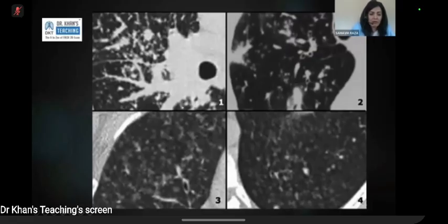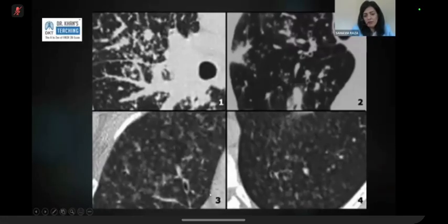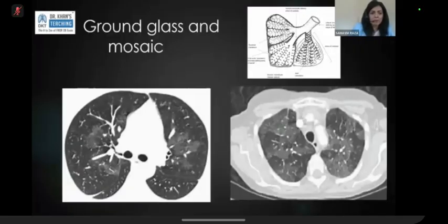Number 3, if you look at the pleural surface, you can see that there are nodules going all the way up to the pleural surface. In some places, whereas other places it's not. The bronchovascular bundles are smooth, they're not nodular. The pleural surface on the other side looks smooth. There are quite a lot of nodules, but they're not specific to any location. They're not centrilobular looking, they're not peribronchovascular looking. So the only pattern that remains here is random. So that's random nodularity, differential being TB or metastases.